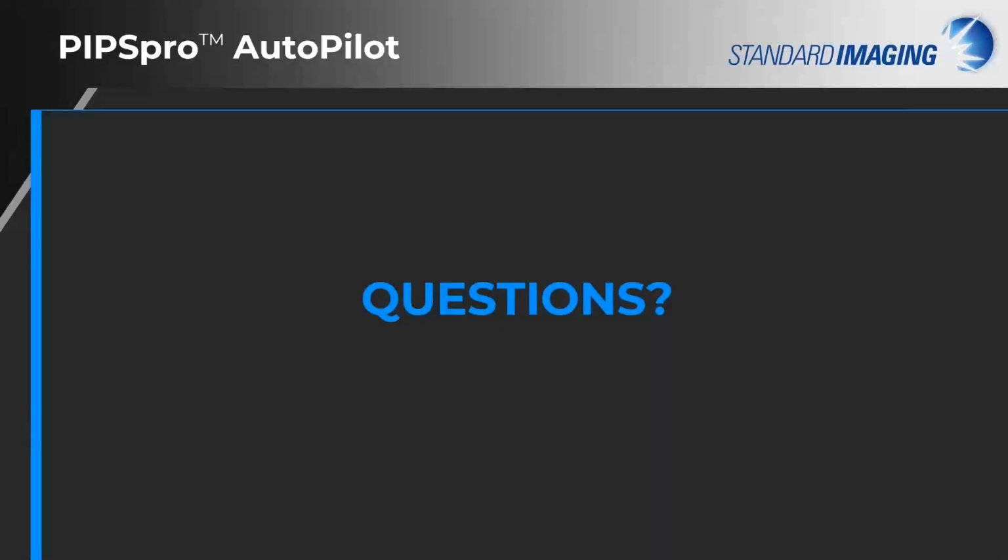I'll give you a minute to ask some questions because that really does conclude what I wanted to show you, and how it truly is very easy to get started with QA Pilot with PIPS Pro Autopilot, or without it, depending on whether you want that automatic image-based test. Also wanted to point out that our customer care team is here to help you to get started and get going.